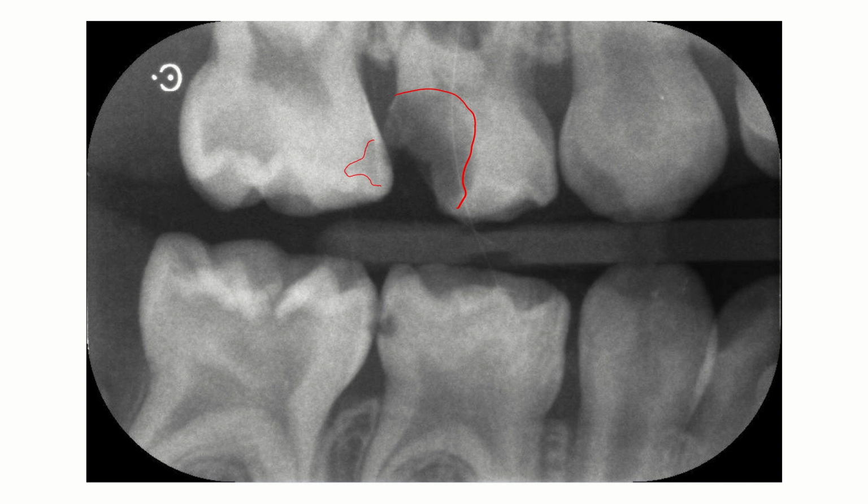We need to remember that we're talking about deciduous teeth here, so the enamel is very thin. Your ADJ is there. So if this was ICDAS 1 or 2, so it remained in enamel only, you would only be thinking about this little bit of the lesion here. But in actual fact, it progresses right into there.